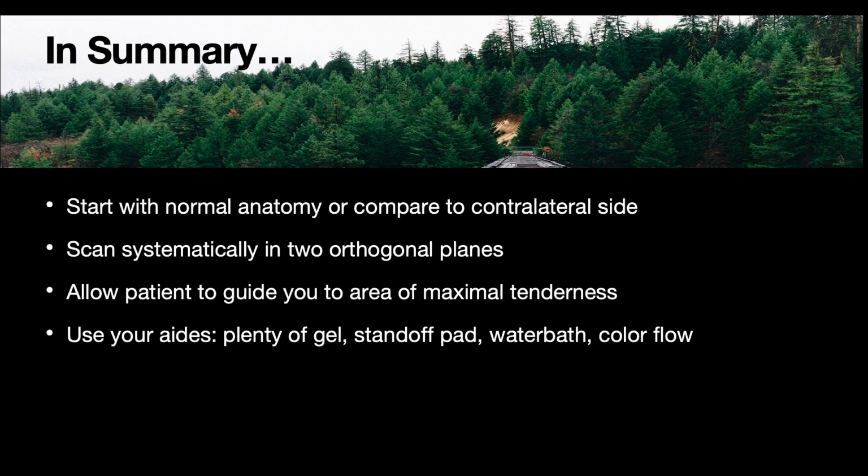In summary, make sure you start with normal anatomy, or if possible, compare the affected to the contralateral side. Scan systematically in two orthogonal planes to give you a better idea of the three-dimensional space of that structure. Allow patients to guide you to the area of maximal tenderness. And use your aids: plenty of gel, a standoff pad, a water bath, color flow, etc.